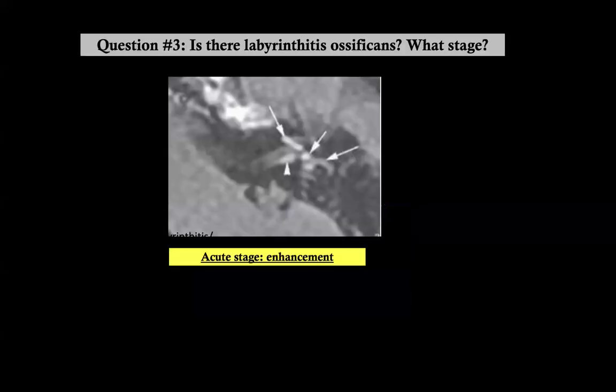So this is the acute stage, during the acute meningitic process. I missed one of these a few weeks ago because I was so focused on the brain changes and the empyema and the pus and the meningitis that I lost it. And then it came back in the audiology MDT for deafness. So very, very important that you pick it up. But in this case, it's just inflammation.